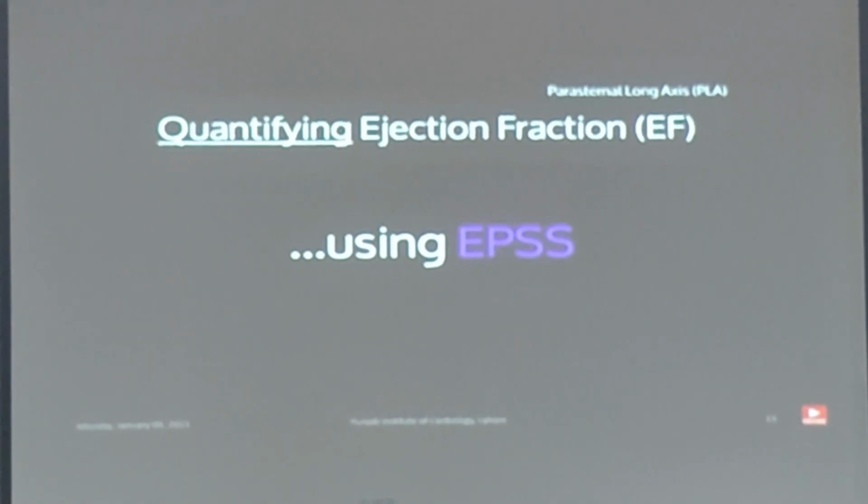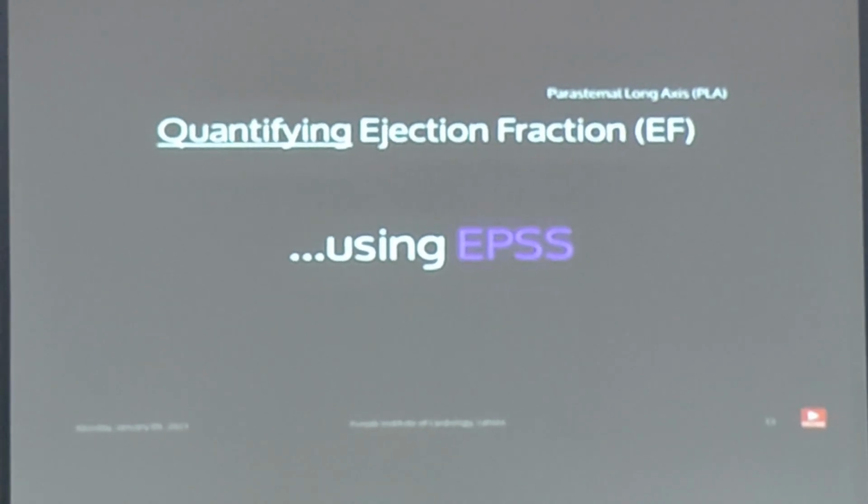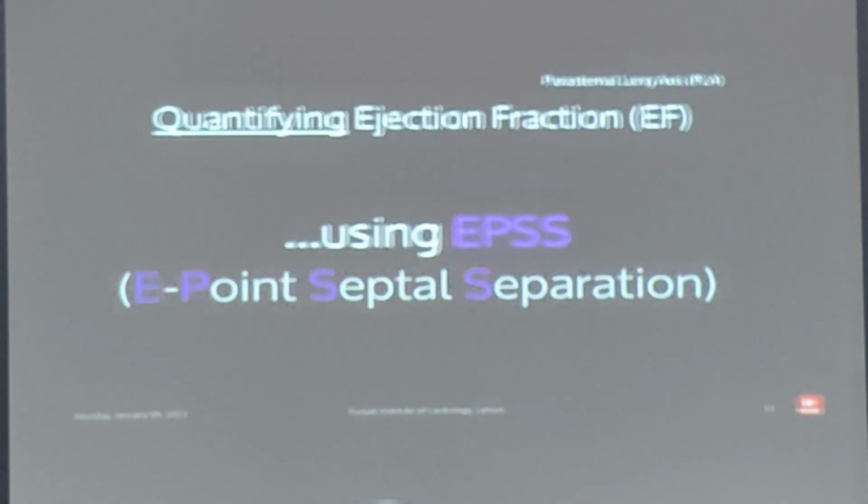The other is using the EPSS point, E point septal separation.